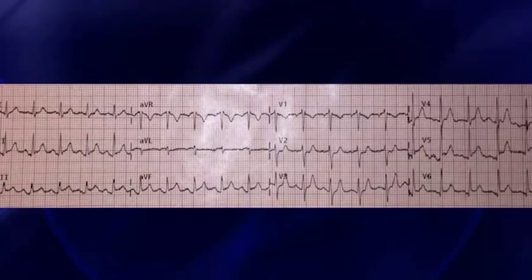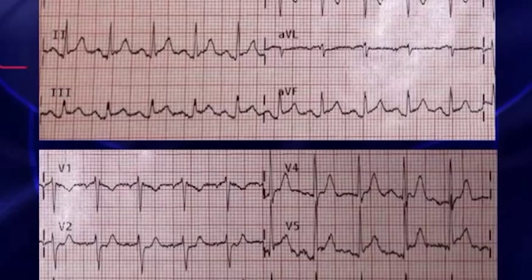The EKG that they obtained in the emergency department wasn't really a whole lot more interesting. This is a really great EKG that's worthy of some discussion. Because it's a pre-hospital EKG, it's a little bit longer than I'd prefer, so I'm going to split this down the middle and put the limb leads up top here, and the precordial leads down here. Take a look, and what do you think is going on?